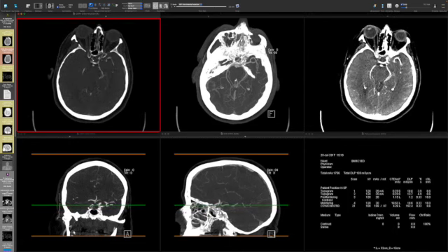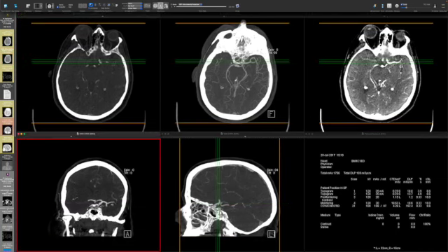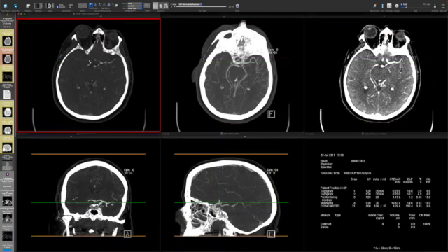And then we come up to the clinoid segment and the supraclinoid segment, again, no enhancement whatsoever on this left side. And even as we come up to the terminal segment, which should be right here, there's no enhancement in that terminal segment. So the distal right internal carotid artery is more likely than not occluded throughout its visualized portion here.